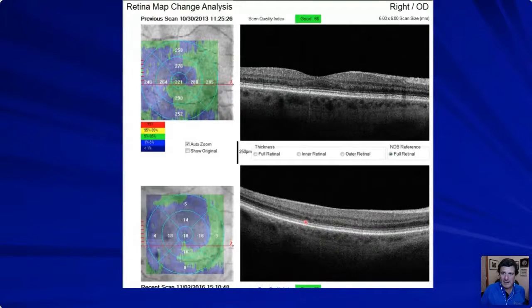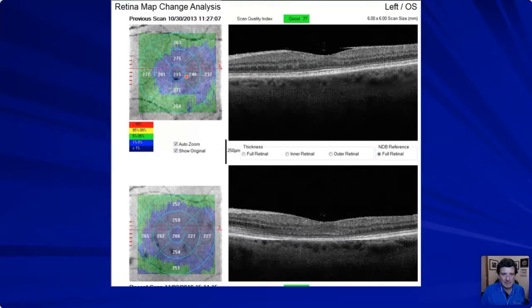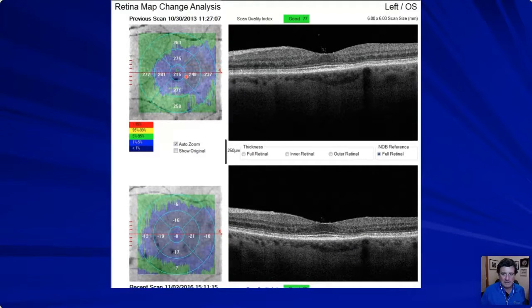That's the right eye. Let me show you the left eye. Again, see this cut right here? You'd have to look in this area. It's a little tough. You want to get down here, right through that macula. So I'm just going to scan through. I have all the scans in here. Take a look. We picked up the changes in this area, and right through here in 2013, she came back 3 years later. She's definitely more obvious.